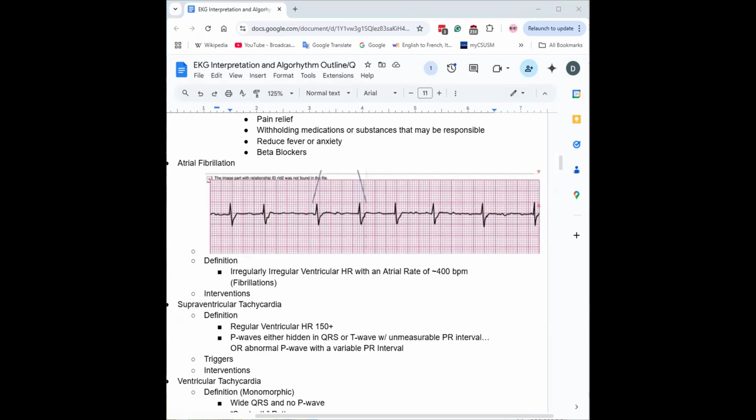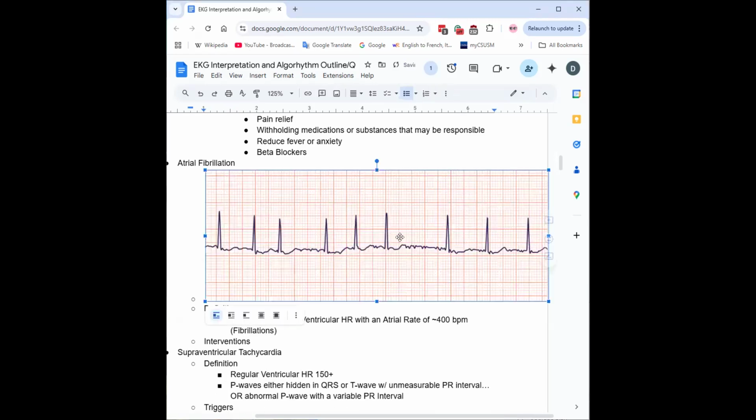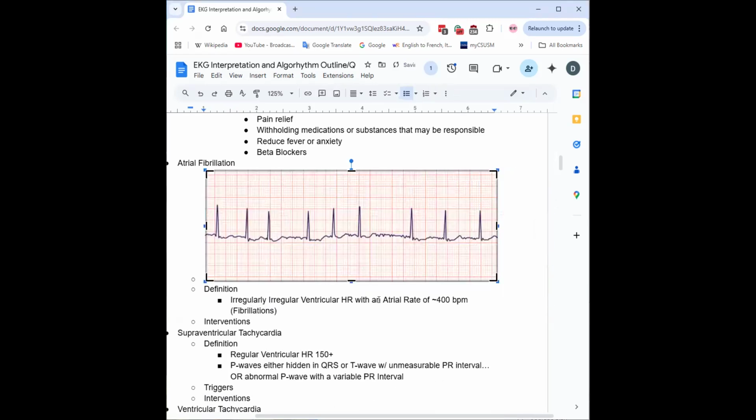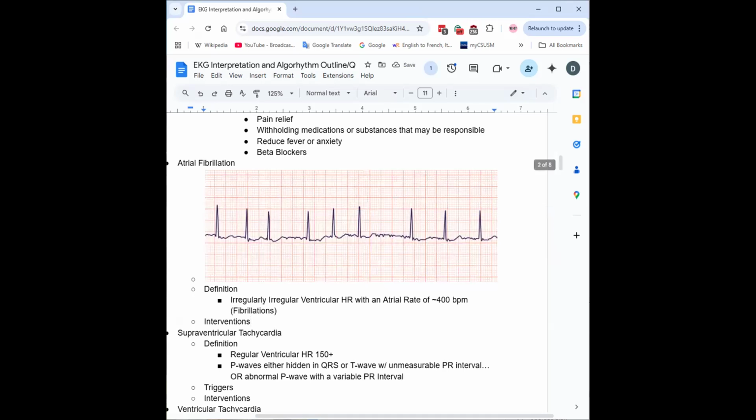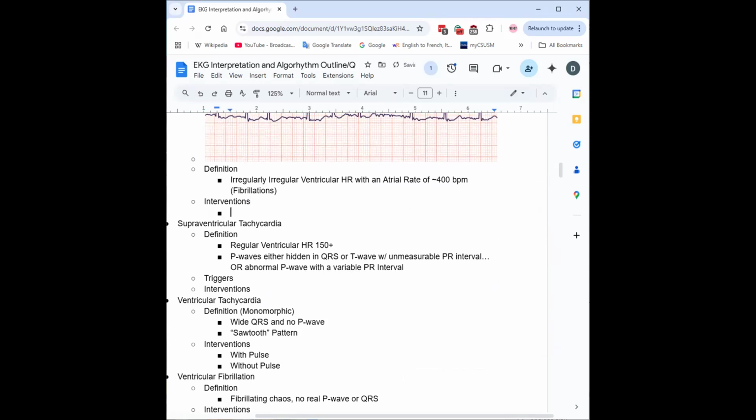This one's kind of tiny, kind of low quality. This one seems better if it lets me. So let us replace it with this one, a little bit higher quality, and you can still see a little fibrillations. Yes. All right, and then I'll see if I can add on anything else. So, cause of stroke, yeah. That is something that you want to keep in mind.